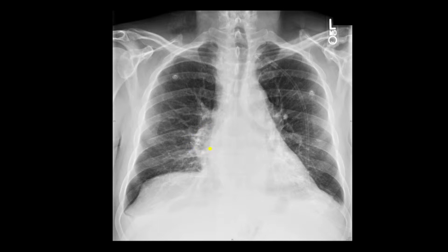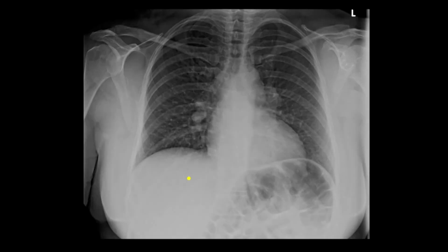patient had lymphoma. In this patient, again, we're going to be looking at the hilar region, and you can see that they have a lobulated contour really at the periphery of the hilum. So you can see these lobulated, increased size lymph nodes in a peripheral distribution. Again, we can see lymph nodes here, little lobulated mass. And so the patient has bilateral lymphadenopathy, and this was a patient with sarcoid.